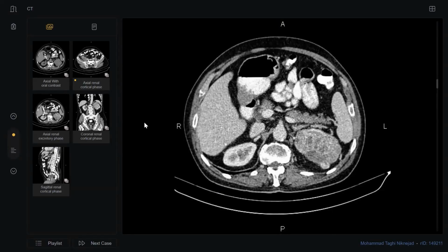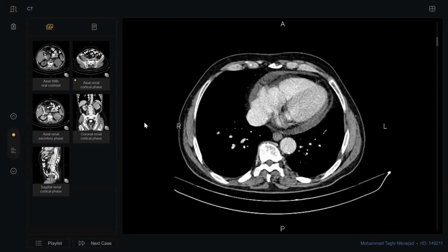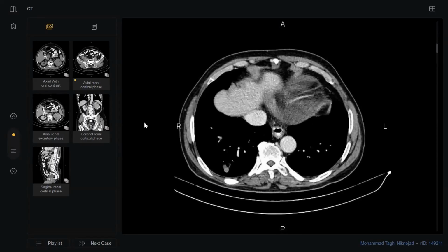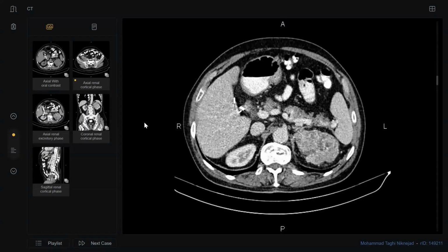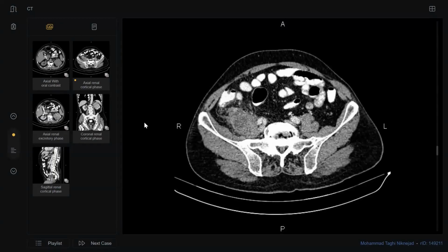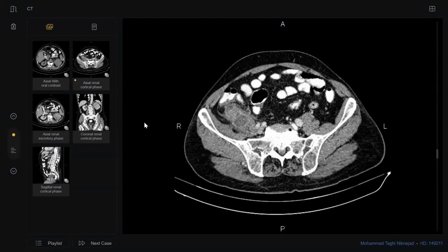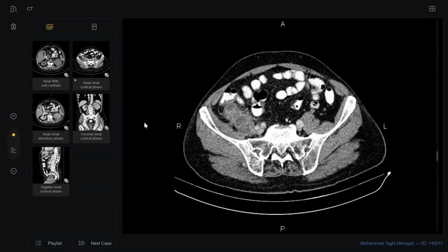See, this is a renal mass which metastasized to the lung, associated with a mild pericardial effusion. This is mild, and this is a metastasis. And I think there are a few hepatic deposits. What about this one? This is another pathology. Yes, sir. It can be acute appendicitis with perforation. I think no obvious perforation. Okay, thank you, doctor.